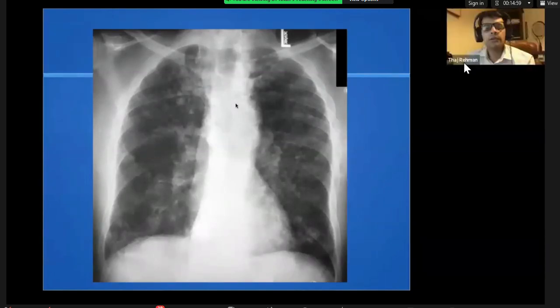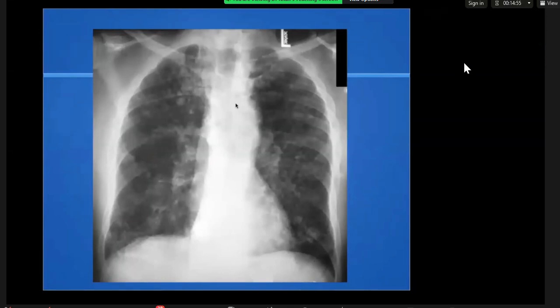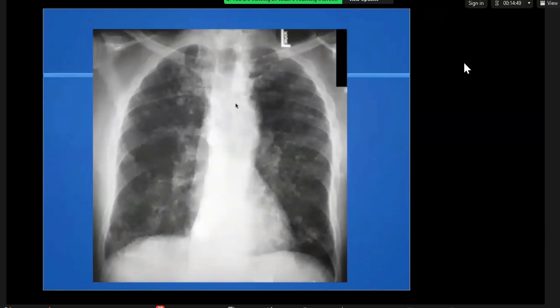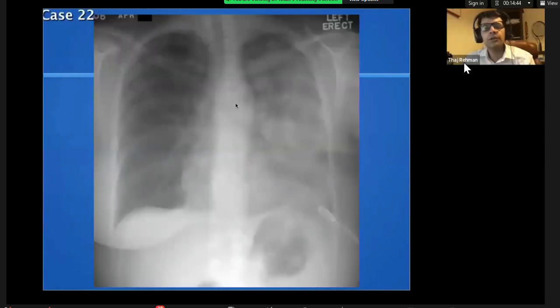So diagnosis or differentials? It could be pneumoconiosis. Yeah. Sarcoidosis. Yeah, totally. Those are the differentials: silicosis, pneumoconiosis, sarcoidosis. I would have thought a bit more pneumoconiosis because they are a little denser than soft tissue, or metastasis. Yeah, very good. Next one.